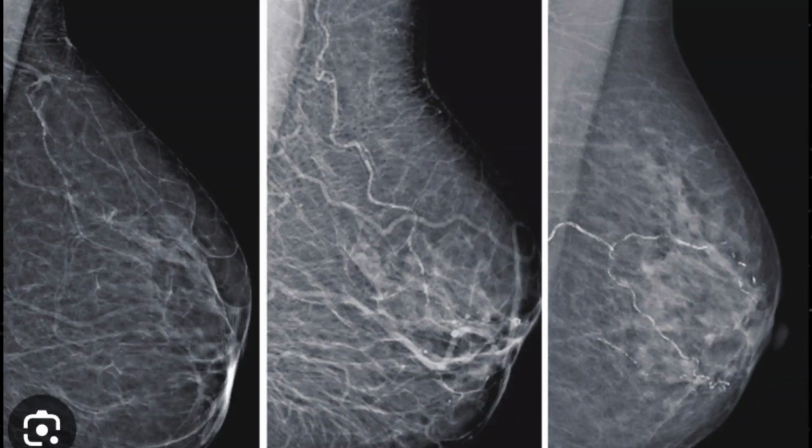These are not pathological, they should not be considered malignant. These are benign calcifications because of the vascular calcified wall. Both walls appear as tramline calcification. This is what the benign calcification appearance would be on the mammogram.